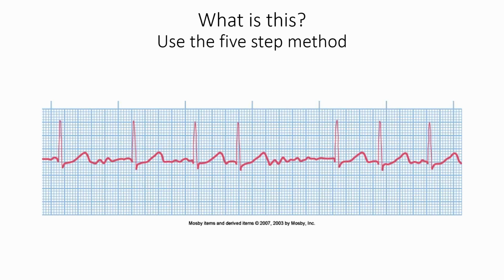So then we're going to look at our P waves. I don't see P waves. I mean, there's a P wave, that one right there, but that's it. And then right here, obviously this is where this person's rhythm has definitely changed because there's no P, no P, no P, nope. So I don't have P's, so I can't measure a PR interval.